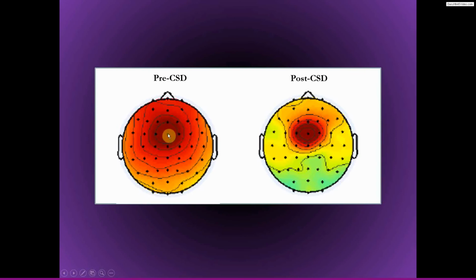So here we can say this electrode, FCZ, is the source of this topographical feature, in the sense that it shows the strongest activity here in the Laplacian. So the Laplacian is acting to sharpen the data, and it will help us identify where on the scalp the signal is really coming from.